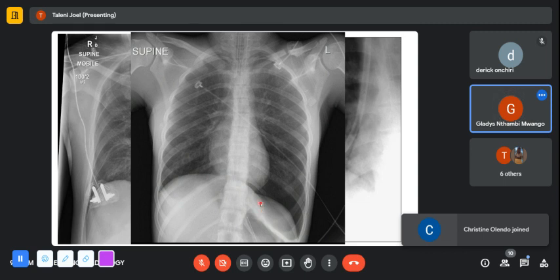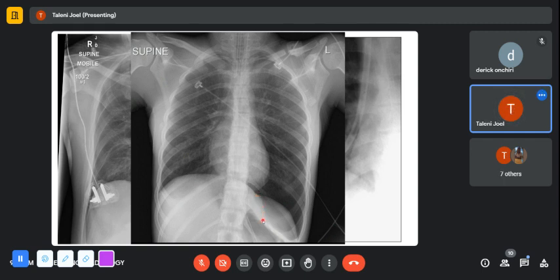Up. There, the two leaves, the diaphragm now divides. There's one that goes downwards rapidly, and there's one that has more of a normal contour. And you can see the one that goes downwards deep, rapidly is what I'm talking about.